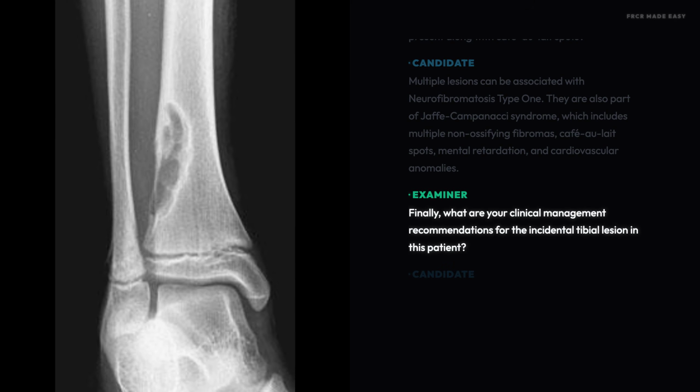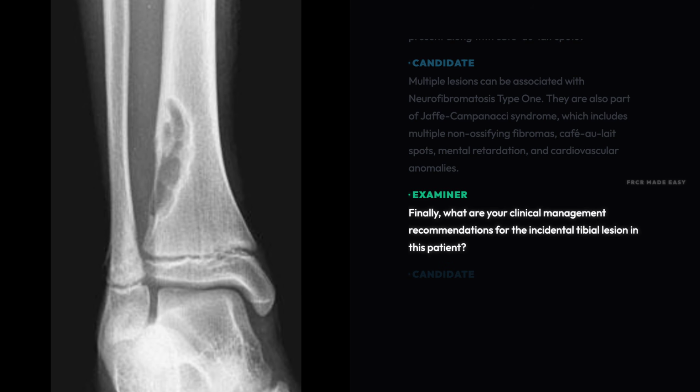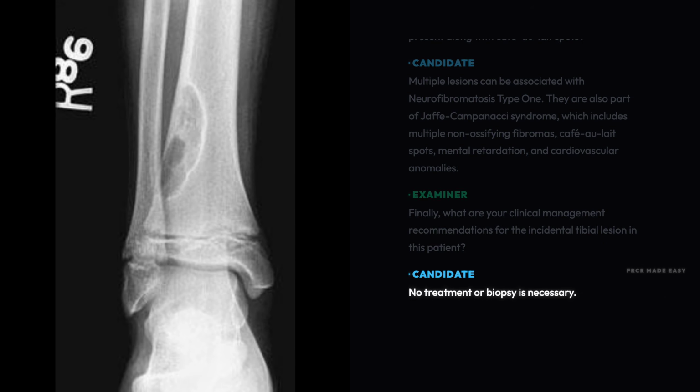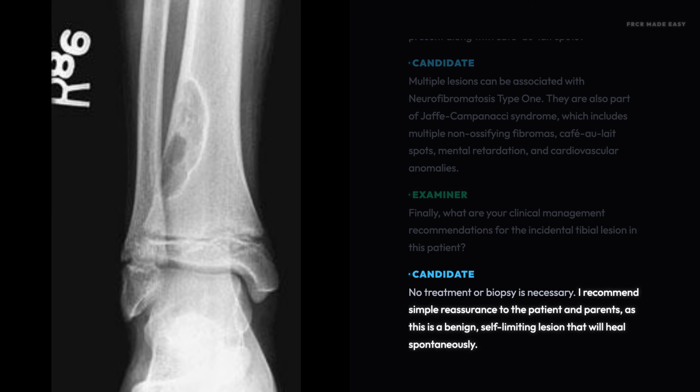Finally, what are your clinical management recommendations for the incidental tibial lesion in this patient? No treatment or biopsy is necessary. I recommend simple reassurance to the patient and parents, as this is a benign, self-limiting lesion that will heal spontaneously.